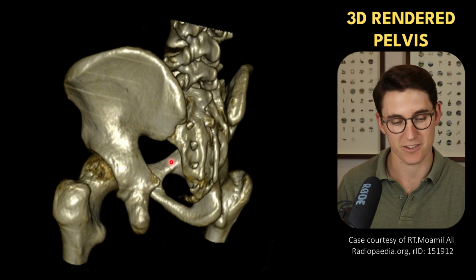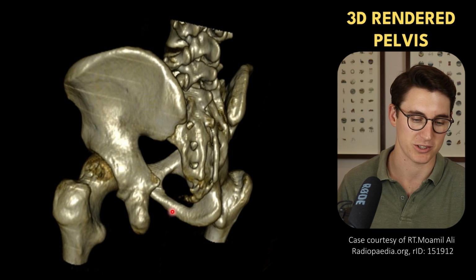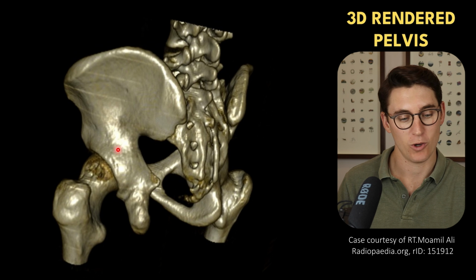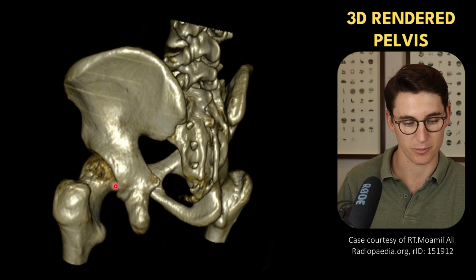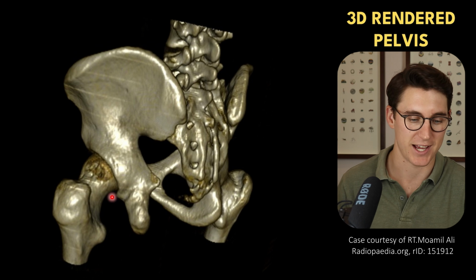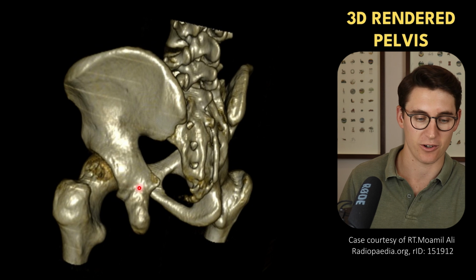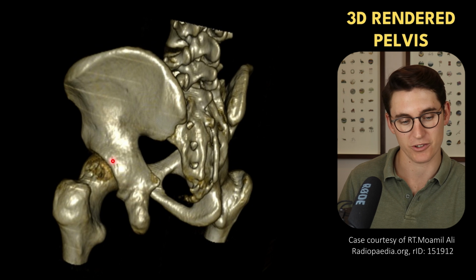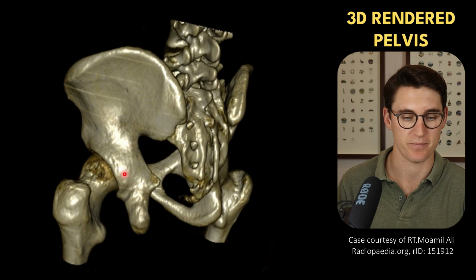On the right-hand side of the patient, you can see the superior pubic ramus and the inferior pubic ramus of our pubic bone. When we think about the acetabulum itself, we can talk about this rim here being the posterior acetabular rim, and anteriorly we have our anterior acetabular rim. And then that thin bone heading out towards our ischium here, this is our posterior wall of the acetabulum. We also have an anterior wall of the acetabulum.